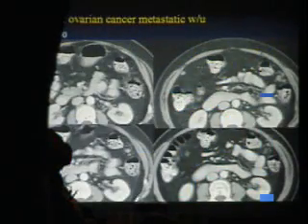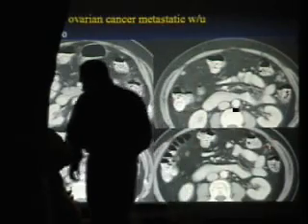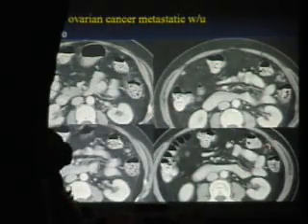Another example of a patient on CT here. Look for the peritoneal implants. This is a study in the year 2000. You can probably, hopefully, see those. They can be quite subtle when it's early. Small little soft tissue things here. They're a little bit like salt and pepper studding of the peritoneum. You need IV contrast to find these most of the time.